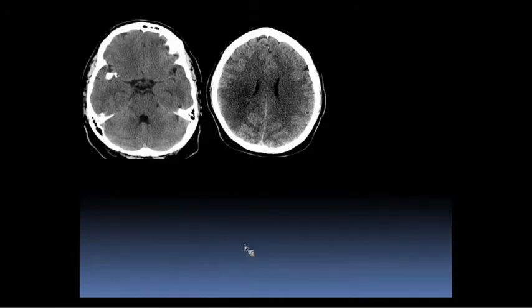So this is, I think, toward the end of my talk. This is a really interesting case I'll end up with. This patient presented to the ER, and this was his CT. So what's going on here? In the first image, we see a chunky calcification here. In the next image, a few slices up, we see what looks like, what kind of edema here?